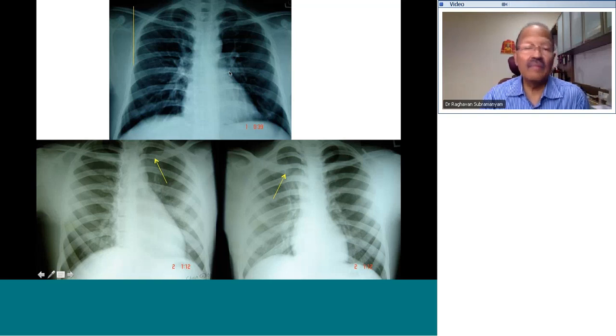That concavity is the place where the left atrial appendage lies in the normal situation, and if it is not distended, that area forms a small concavity. And then you can have another small bulge, often due to the right ventricular outflow tract, but most of the left lower cardiac border is formed by the left ventricular apex. It's interesting to see that the right ventricle does not form any of the borders in the normal heart.